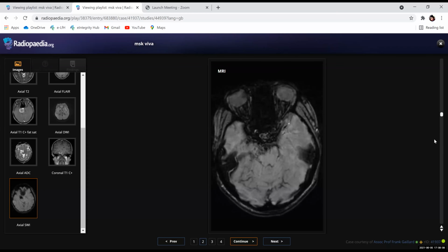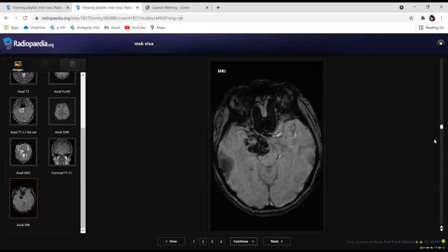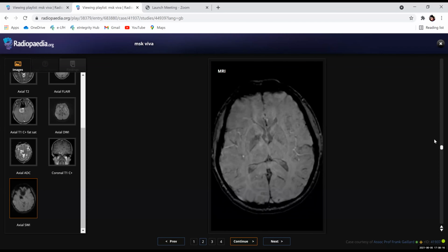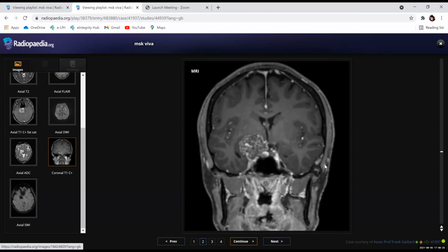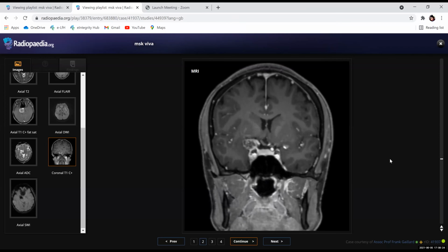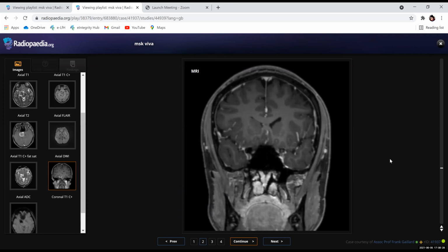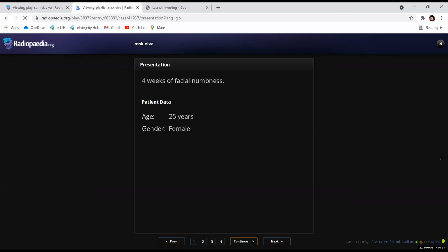There is a chordoma. Like chordoma or any aggressive. Chordoma is central. It can be an aggressive variety of a chondroid tumor. Like if it's an elderly patient, it can be... I think this patient is 60-year-old or something. Can be chondrosarcoma. Sorry. Yeah. 25 years.